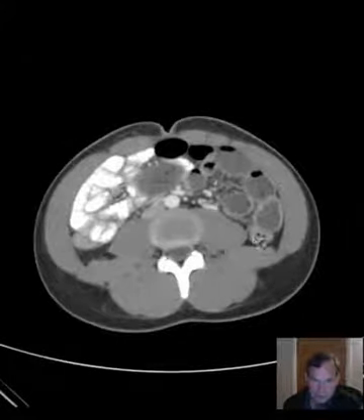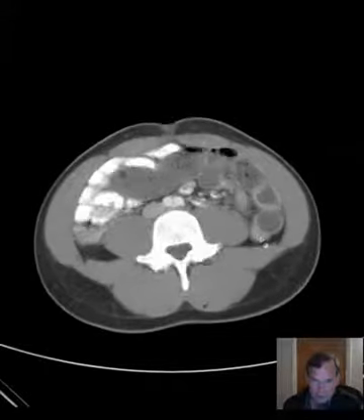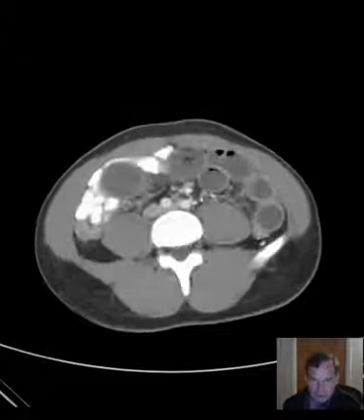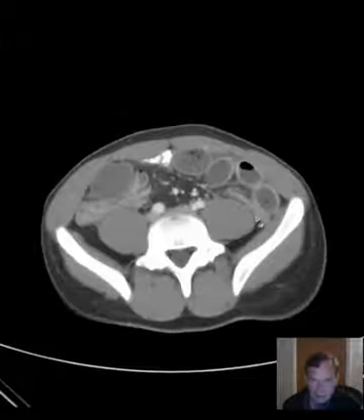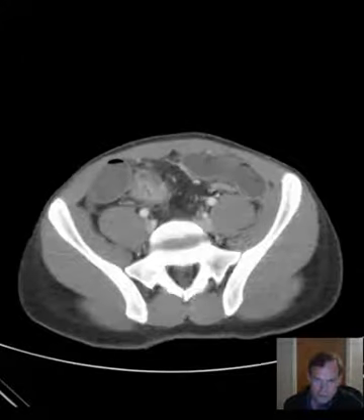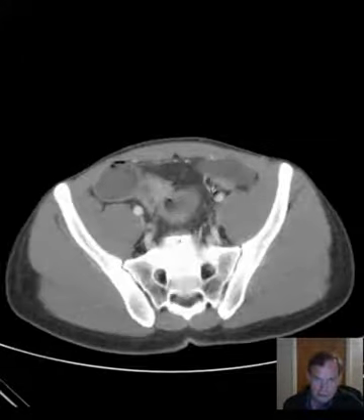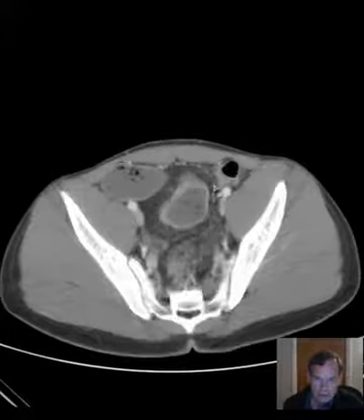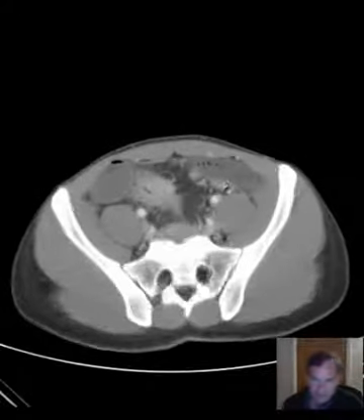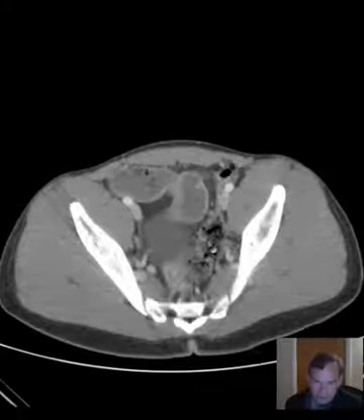No, here is the distal left colon, and we have to try to find the sigmoid colon. Well, this collapsed colon here looks like it's coursing over this way, and then it's very hard to follow at that point, but I'm confident up to that point.